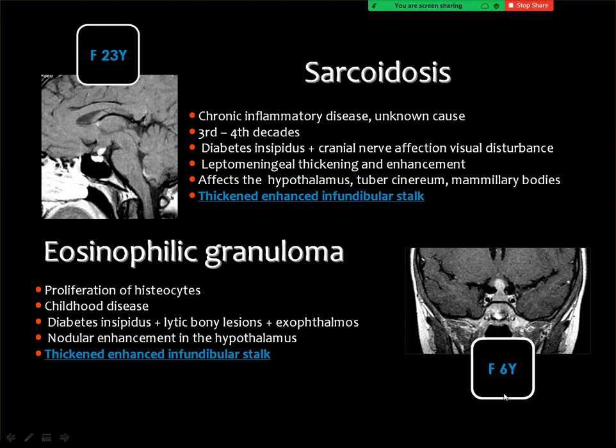In order to differentiate the three lesions from each other, all the lesions present with a thickened, enhanced infundibular stalk and prominent enhancement of the pituitary gland.